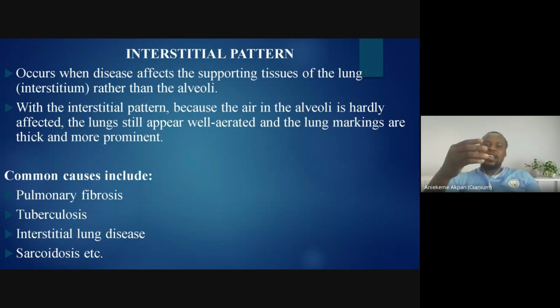And this interstitium has lymphatic drainage. That's why sarcoidosis is very possible in them. So this interstitium, over time, maybe due to tuberculosis or any disease that is affecting them, can become hard, and they can become nearly destroyed and can show on chest X-ray as nodular patterns, can show as reticular patterns, can even show as both of them, reticulonodular patterns.